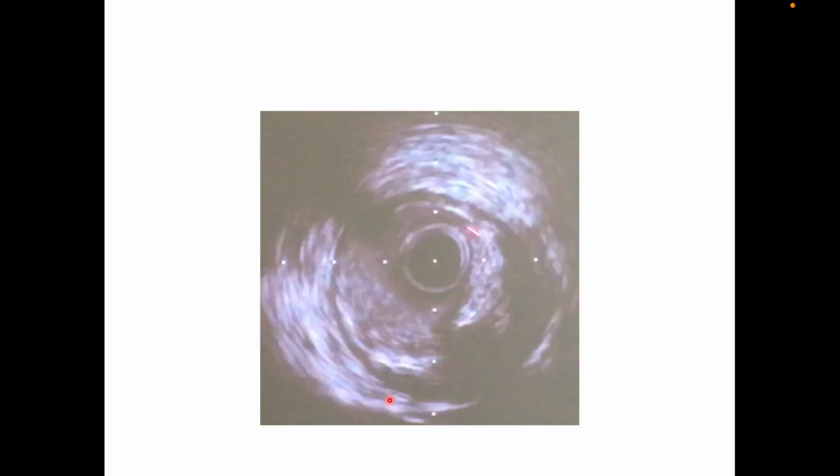So, another image. Again, if you start identifying, there is an intimal dissection here because that's the intima layer and it's dissected, and the dissection is extending all the way into the media. You can see how big the media is, and then it's the adventitia outside that.